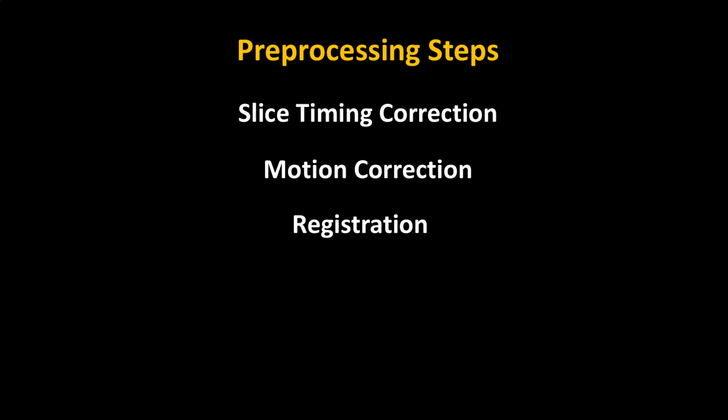So before we get started, I want to go over each of these briefly, show you an animation. Again, you may have seen this during FSL, but for those who are new, just to know what we're dealing with, here are the main ones I'm going to talk about. So slice time correction, motion correction, registration, normalization, and smoothing. Let's take a look at each one of those.